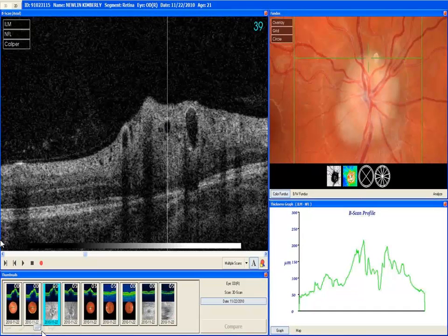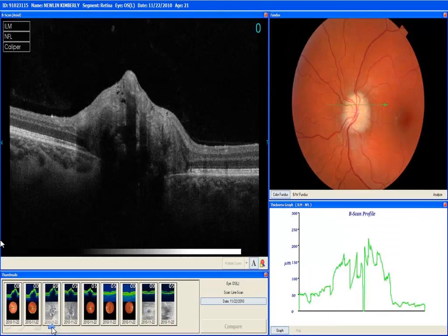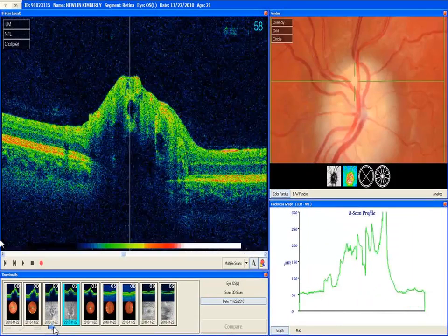So what we did is take one disc drusen that's very obvious clinically. We can see it with an ophthalmoscope, with a fundus camera, looked at it, did an analysis on it, and now we think we know what to look for in other patients or in other areas of the disc. So let's blow this one up.